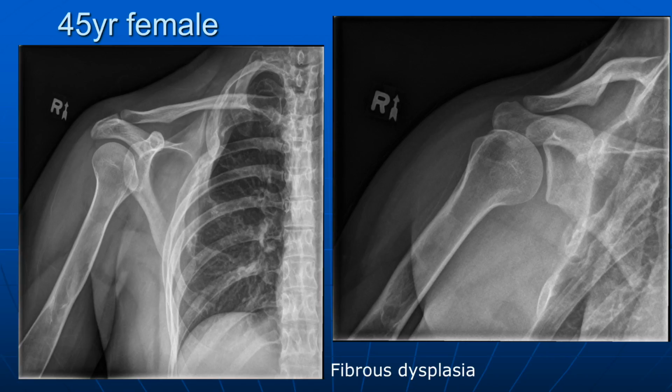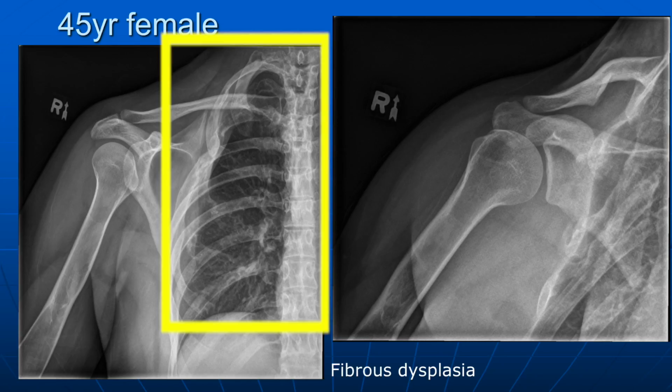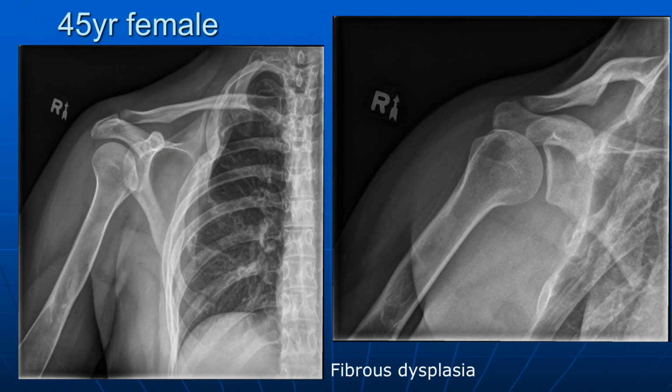So actually, yeah, this helps you with the diagnosis. The ribs are abnormal as well. Can people see? The ribs are all abnormal. So the more you look, they call it search satisfaction, don't they? You see one lesion, you stop looking. Have to keep on looking. It's like the arthritis as well. If you find one erosion, look for any more that can help you with what it is.